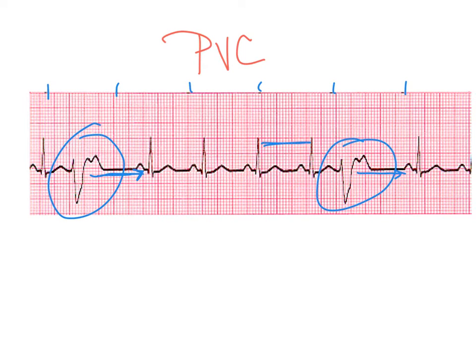I would have some concerns. So it's just something to look at. This is a quick overview. You can do better measurements than I can right now. I just want to give you a quick video that you're not going to take too long with, but you can go back and look at.